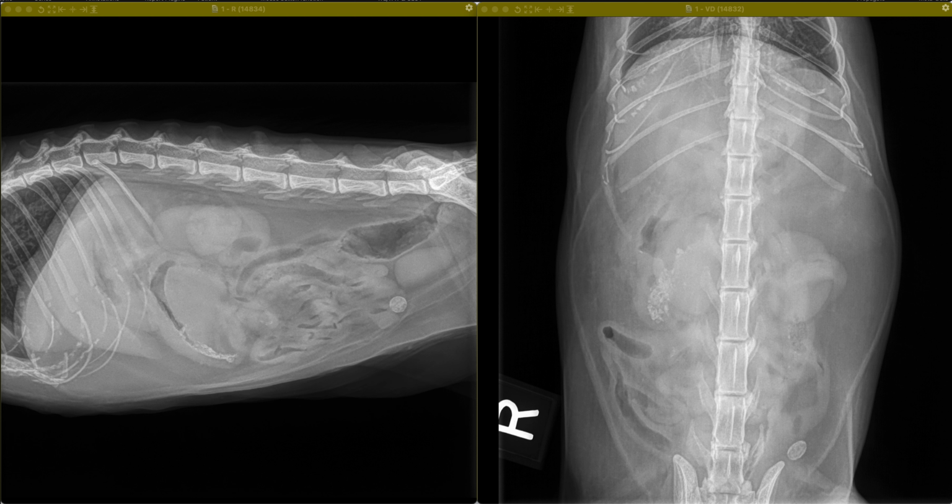Of course, we would be concerned for the presence of intracellular bacteria, which could indicate a septic process or a septic peritonitis. Be sure to view the full report associated with this case. It will also cover the thoracic imaging.